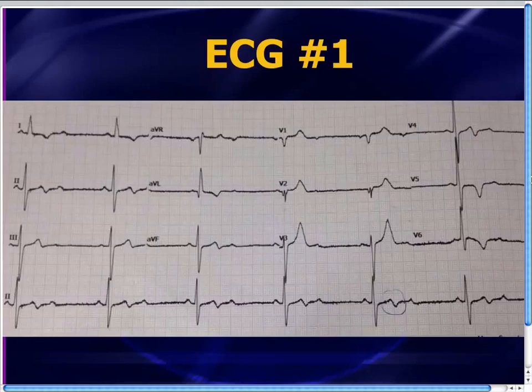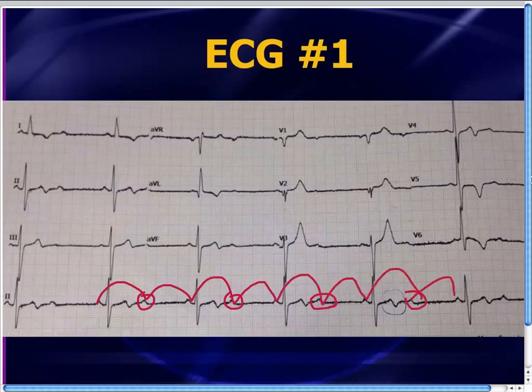So now let's switch over and just focus on the rhythm during the rest of the discussion. You notice, first of all, hopefully, that there's a sinus rhythm, there's P, QRS, P, QRS, P, QRS, and so on. But there also appear to be P waves that are not being conducted, right? All the way across the EKG rhythm strip. And in fact, if you map these out with your calipers, those P waves do map out with the conducted P waves. So this is a completely regular sinus rhythm that goes all the way across.